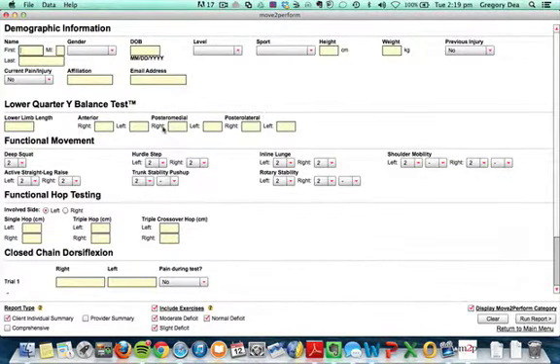We enter some data, so I'm going to put some false data in here. Let's say Joe Blogs. Sorry, first name is Joe Blogs, gender male, date of birth, it's in the American system, so let's say the 1st of January 1995. Sorry, let's say the 1st of July.